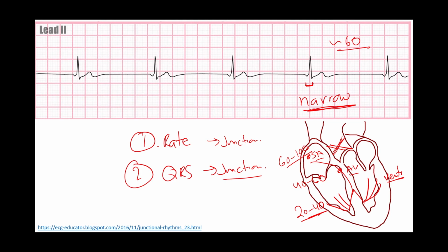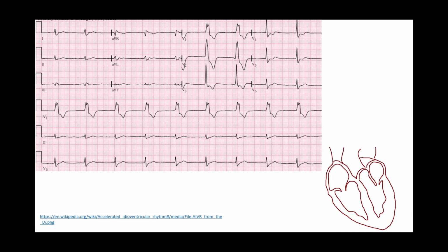So the general rule of thumb I want you guys to remember is sinus and junctional rhythms are usually narrow complexes, while ventricular rhythms are usually wide complexes. There are always exceptions to this rule, and very important exceptions, but at this point, I just want you to remember that rule of thumb. Finally, if you eyeball the distance between each R wave, you'll notice that this rhythm is occurring in a pretty regular fashion. Okay, take a moment and try this EKG out.